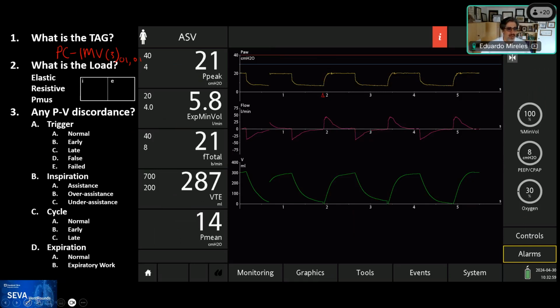this feature that they have, which is called IntelliSync. And so you would see that. So all of them are triggered by the machine. So immediately they become mandatory because one of them is, so all these three that we see are mandatory. Rob, any comments? No, not so far. That's good.